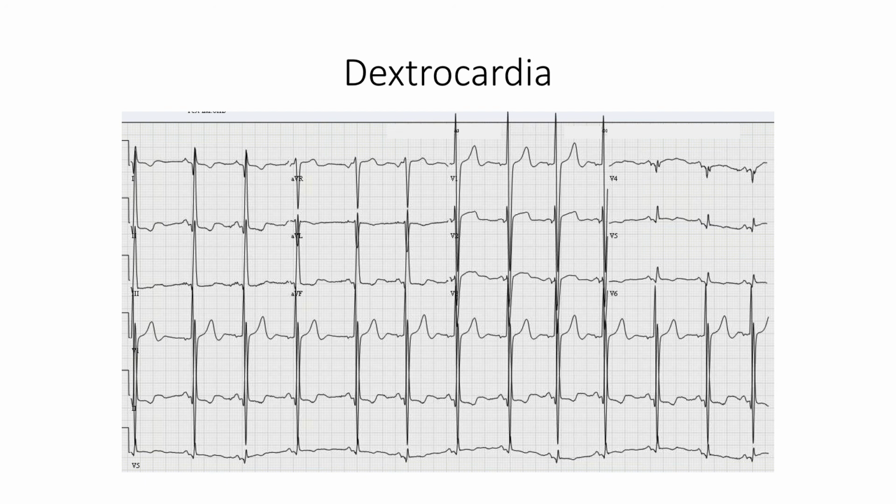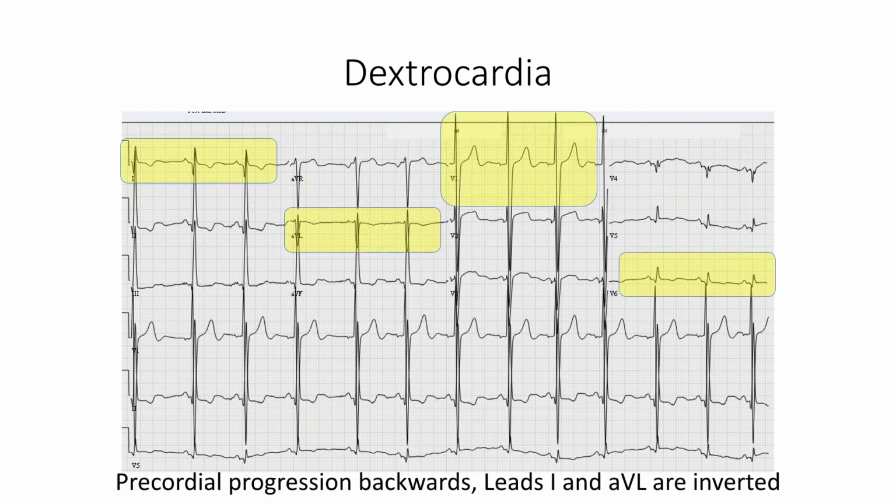Now here's an interesting ECG, and sometimes you'll see this in patients on routine physical exams. And you can commonly see this on your pediatrics rotations and in internal medicine shelf exams, and they like to test this a lot on both the shelf exams and the board exams. So notice here how the leads that point at the left shoulder, i.e. leads 1 and AVL, they have a negative downward pointing S waves and inverted T waves. Normally we would expect these to be positive, but like we discussed earlier, in this case it's negative.